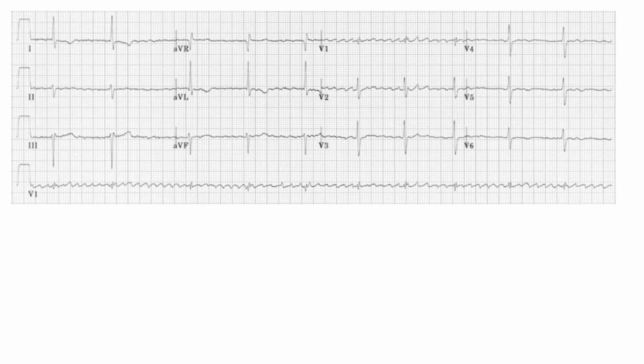Now this is a very interesting ECG. If you see here, V1 is shown here. As you can see, there are fluttering waves or fibrillating waves. These are fibrillating waves shown in V1. So this is a case of atrial fibrillation. Anyway, we'll be discussing it in the tachyarrhythmia section. If you are not able to identify it, it's fine. It's a case of atrial fibrillation.